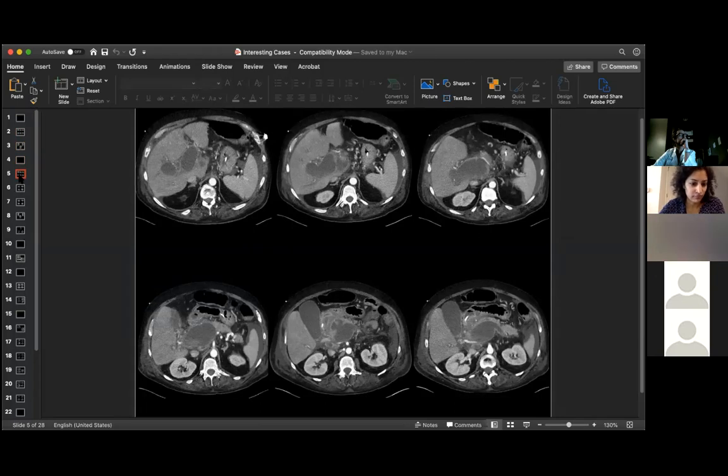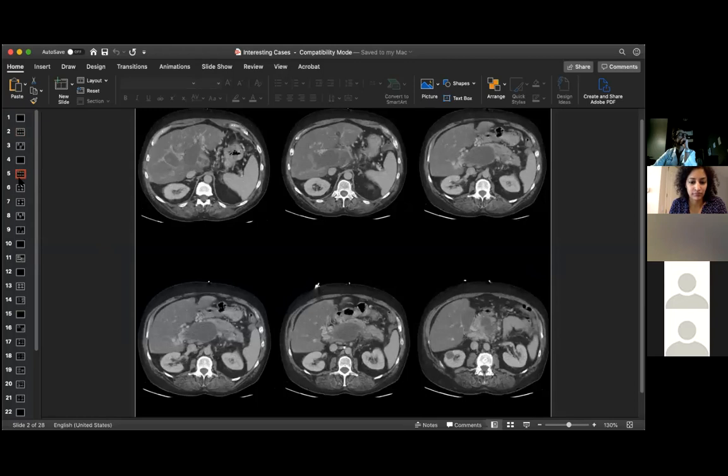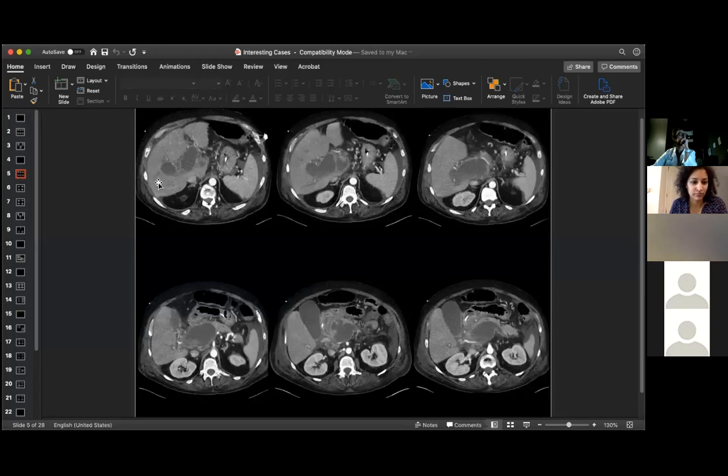So I'm going to show you, this is the arterial phase. So same thing. We see this structure that is highly expanding the portal vasculature that seems to be associated with the pancreas. You can see that it's doing the same thing. This is the splenic vein. Can you see my arrow? Yes. Okay, and then we have this high density material again, right here layering, here dependently, here not dependently. And it's difficult to compare if you're not doing it yourself, but the structure has expanded between this scan and this scan. So it's evolving, and you can see now we have a little bit of buildup, which we didn't have on that initial scan.